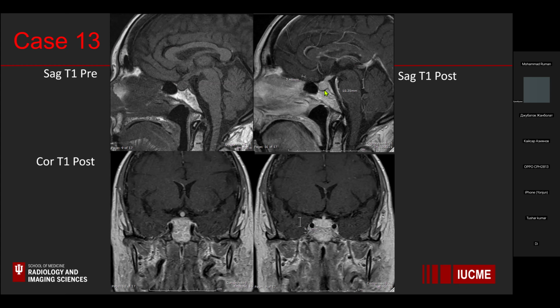So something is wrong that's involving not only the gland, but also the infundibular stalk. I shared a nice case of pituitary apoplexy with you earlier at the beginning of the talk, and this is something very different, right? If I took away the infundibular stalk, it would look like pituitary hyperplasia. But in this case, the stalk itself is enlarged as well.